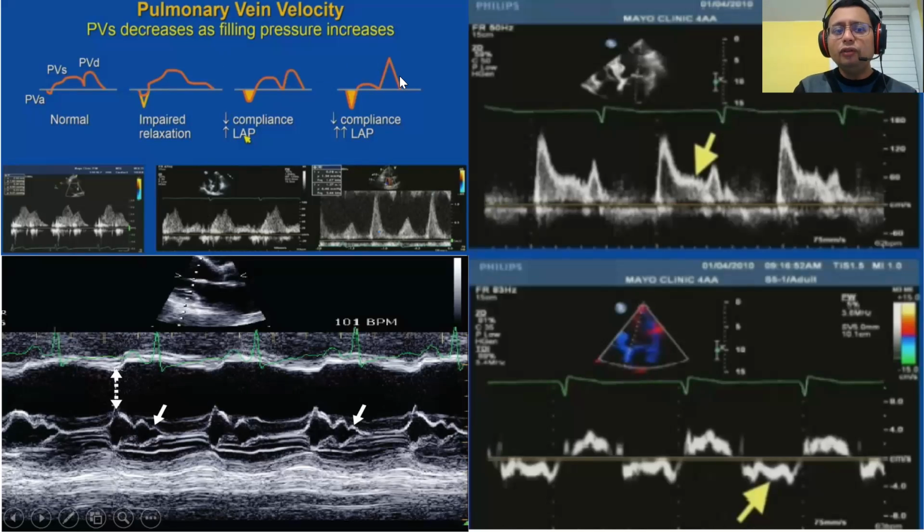However, even though this pattern repeats itself, just like the mitral valve filling, you can see that the pulmonary vein reversal actually goes longer, from here to here to here. So the reversal goes longer and longer and longer.